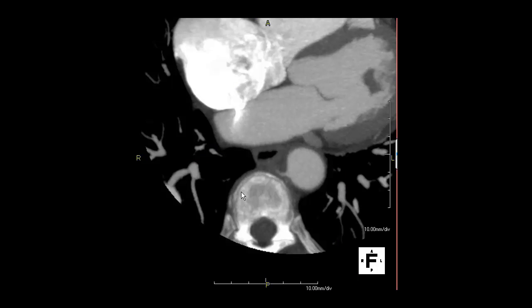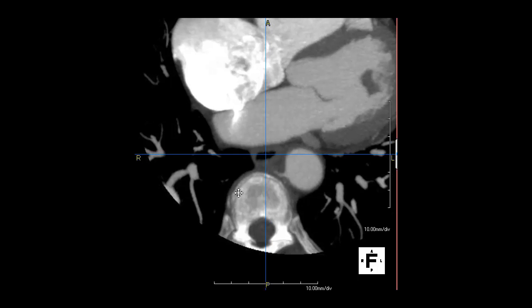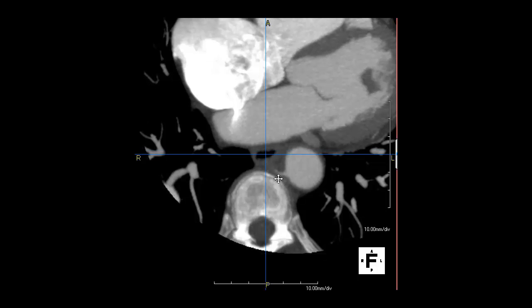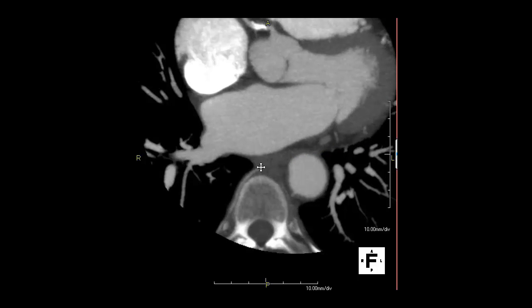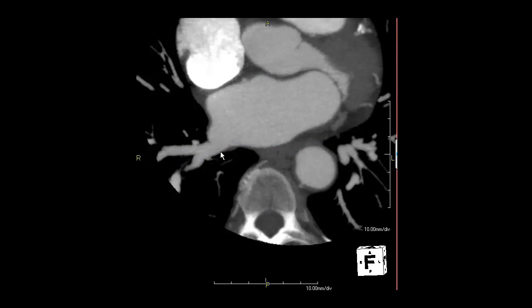One important assessment for the electrophysiologist is to determine the location of the esophagus as it relates to the pulmonary veins. Here's the esophagus. We're going to go somewhat cephalad. This is the esophagus over here, and here is the right posterior inferior vein. So at this level, there is no concern for the potential for a catheter inserted in the right posterior inferior pulmonary vein to potentially have a problem related to the esophagus and the exterior regions.